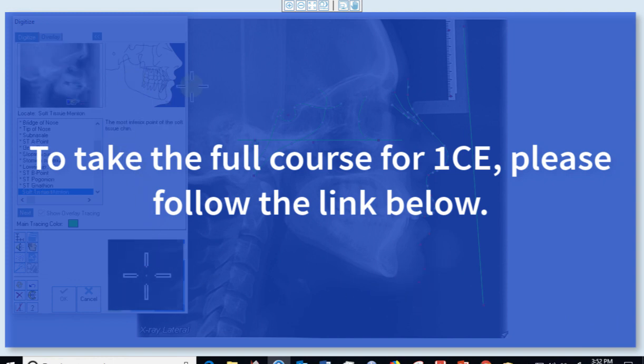I don't want to spend a lot of time here because I'll put everybody to sleep, but each of these points has a description, and we are going to cover that in our mini residency class and some upcoming online courses as well. The best thing to do is either use our manual as a reference, or simply Google it, or use our required textbook, which is the Proffit and Fields and Sarver Contemporary Orthodontics textbook. Or simply follow the instructions that Dolphin is giving you.